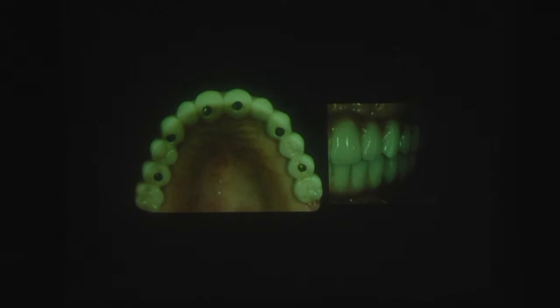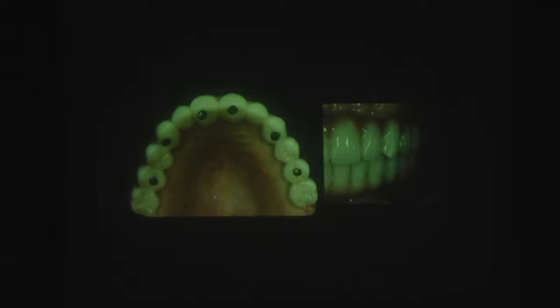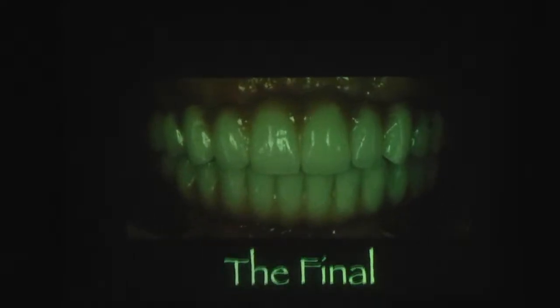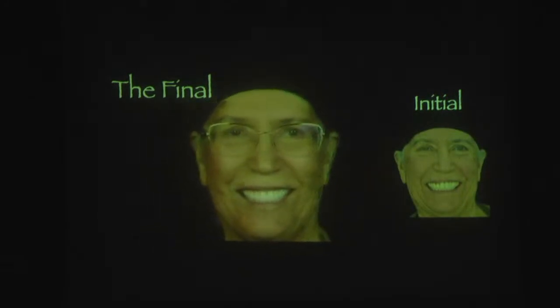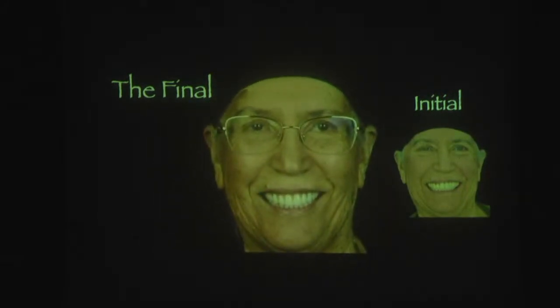We're going to finish it. Okay. So the 21, 22, and 23, okay? And this is the final. Initial part and the final part.